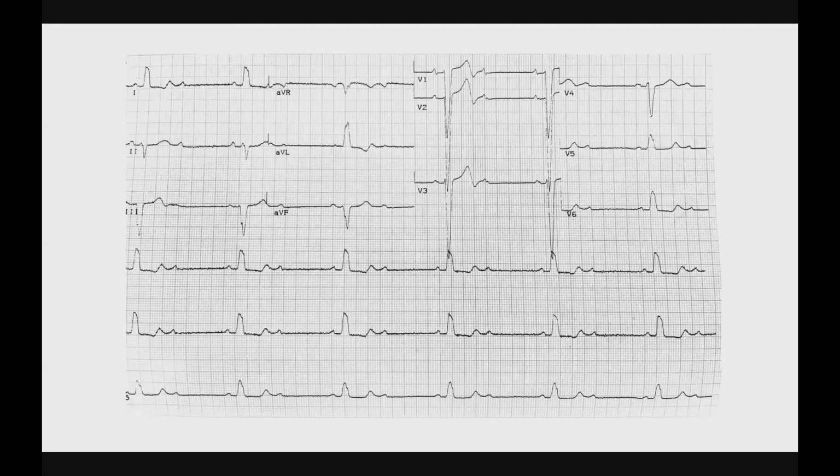I'm seeing a few broad QRS complexes in lead 1, V1, V2, and V3. I'm also seeing a biphasic T wave in V2 and V3.